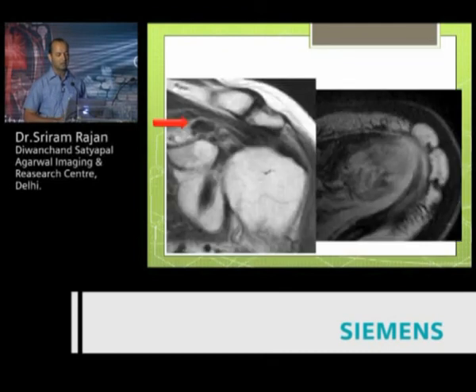And lastly, this is a case in which the cuff itself is intact. You can see a hypointense structure which is dissecting into the myotendinous junction, which shows blooming on the MEDIC images. That's hydroxyapatite deposition disease dissecting into the cuff.